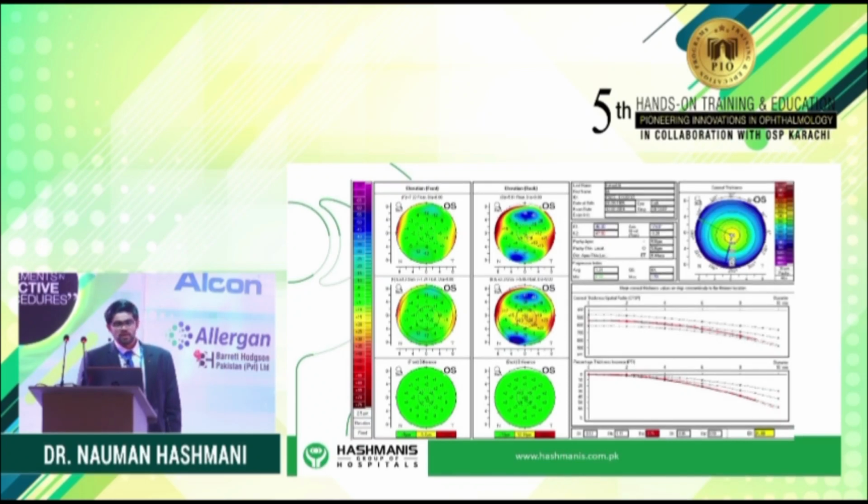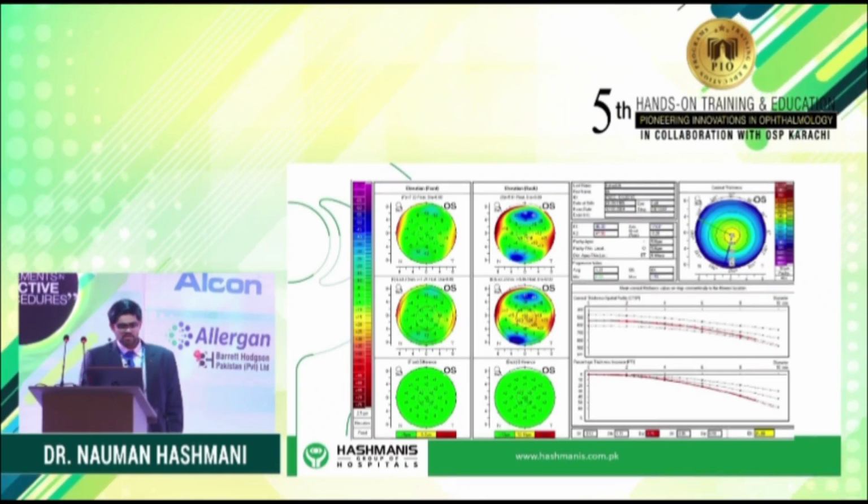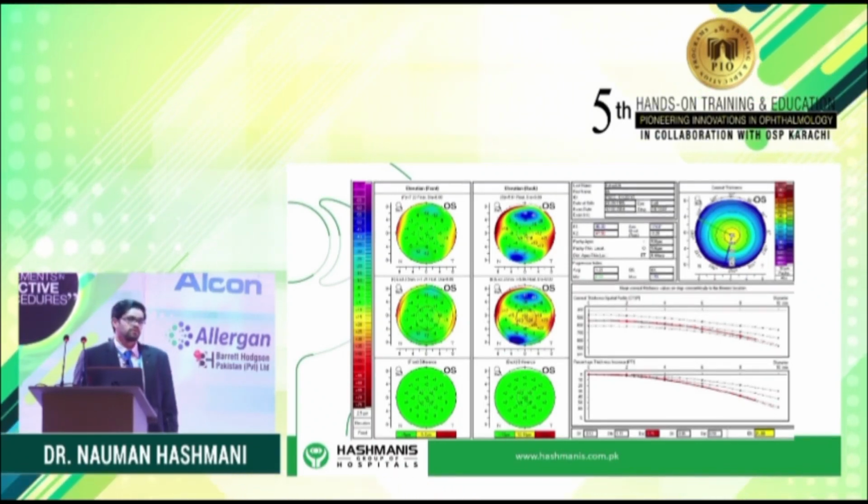And then you go on to the Belin Ambrosio display, and you're seeing something called a quick sloping curve, and you're seeing a high average of 1.31 and a D value of 2.33, which is in the yellow range. And look at the progression index. It's gone into the red, which is the highest predictor in this entire model, and that's why you have a yellow D value.